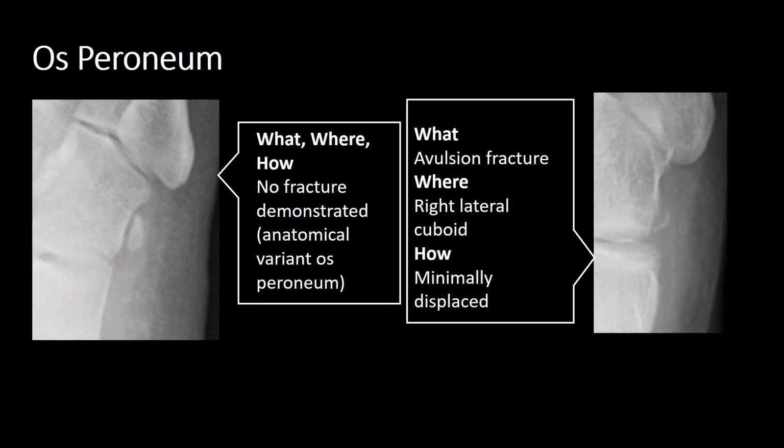Let's look at the avulsion fracture. Here we have a tiny sliver of bone. Let's look at the cuboid now. Here we can see the dense cortical margin. If you look opposing the avulsion fracture, this cortex has been lost. There's lack of definition. So compare the two. Smooth, well corticated, sharp, irregular, loss of cortical definition.